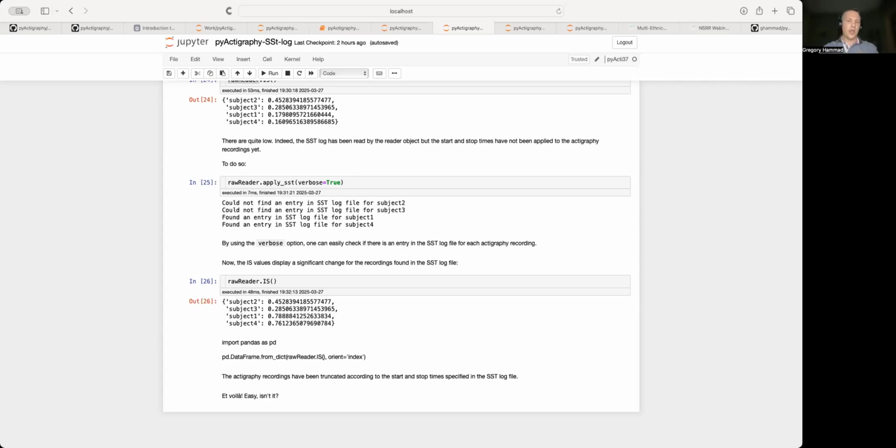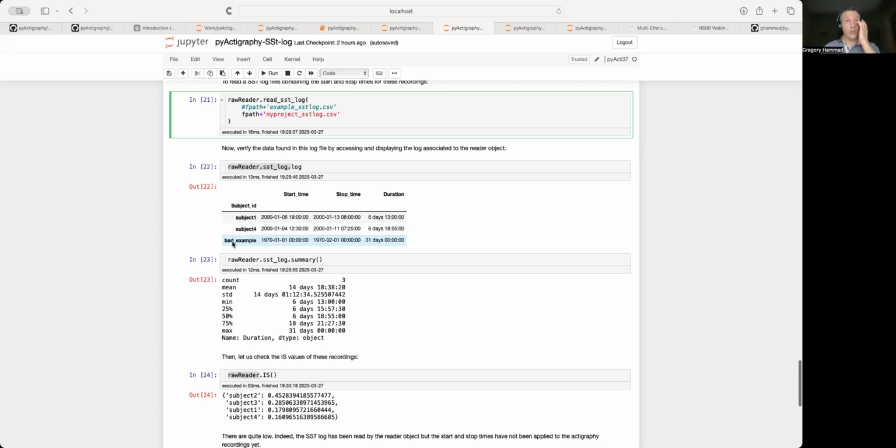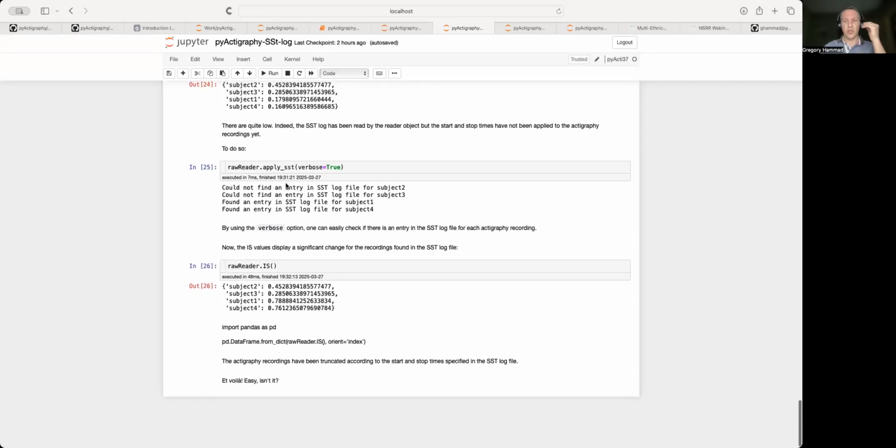And then it might be just the foundation for building up your own analysis notebook. And also there are plenty of things that you can do if you know how to manipulate data in Python. Luckily, Python is a really large ecosystem with plenty of tutorials and resources. So you can easily find, once you understand that behind the scenes we are using standard packages that render the data in tabular way, and then you can manipulate them. You can do whatever you want actually with those. Okay, so that was for.